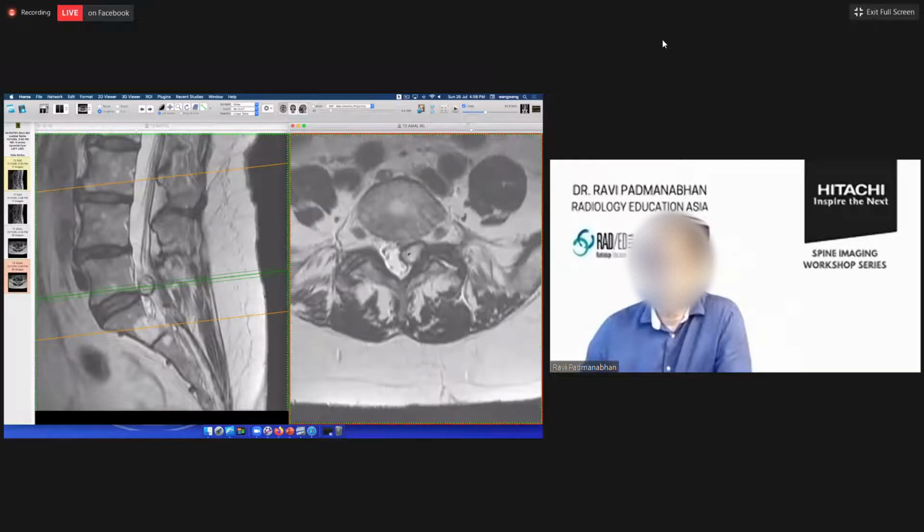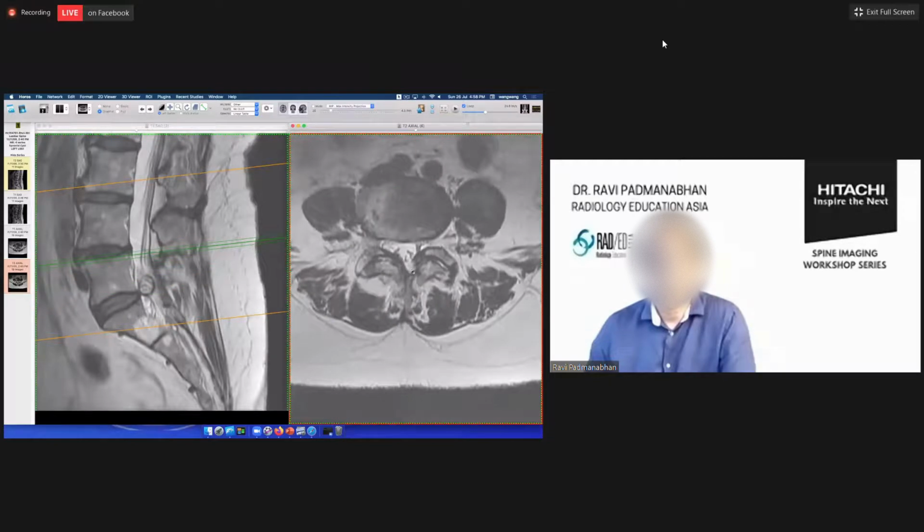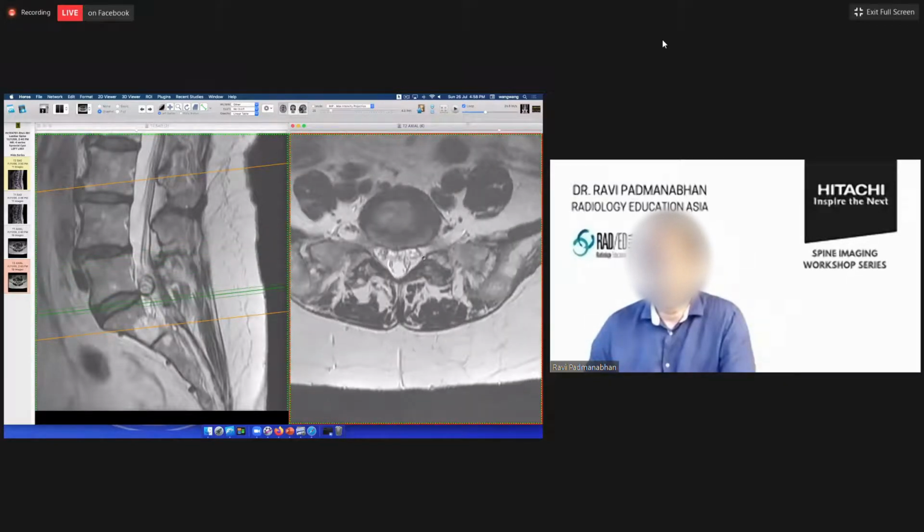And now which nerve root is going to be involved here? We're at L5-S1. Which nerve root will be affected? It'll be the traversing nerve root. So the traversing nerve root is the S1 nerve root. So we would say all those things about the cyst, and then at the end you'd say that there is compression of the traversing left S1 nerve root. Okay, and then if you keep going further, you see S1 here.